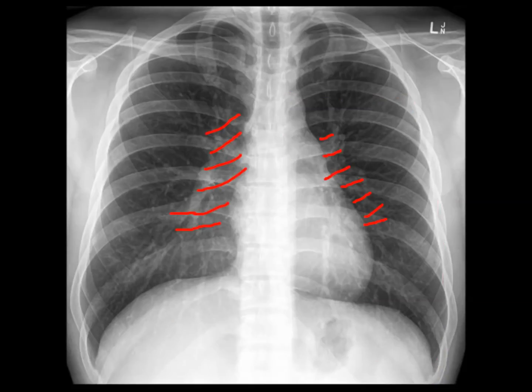Finally, let's look at the lung hilar, the mess of squiggly stuff above and behind the heart. The hilar consists of pulmonary blood vessels, the main bronchi, and lymph nodes, although you should not be able to see lymph nodes in a normal patient. There is an indentation in the hilum on each side called the hilar point, and normally it's higher on the left than the right.